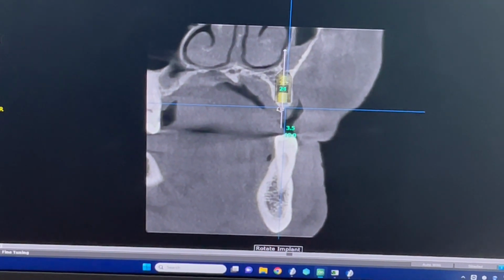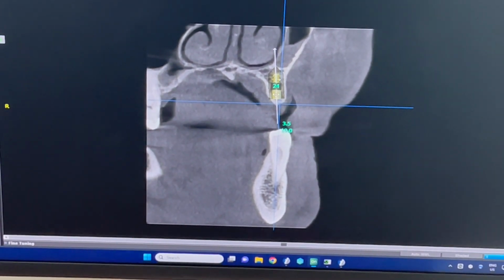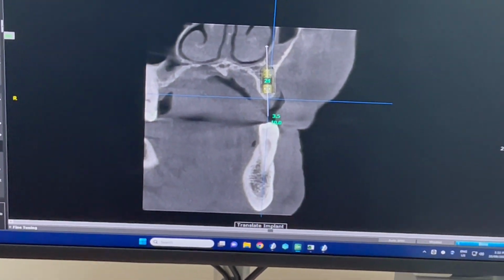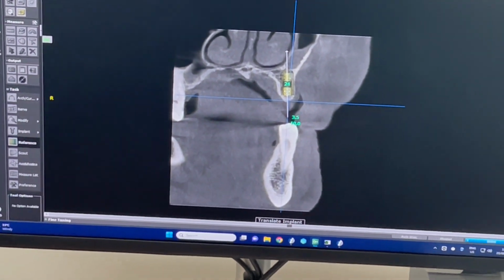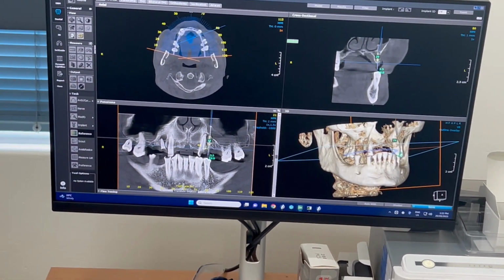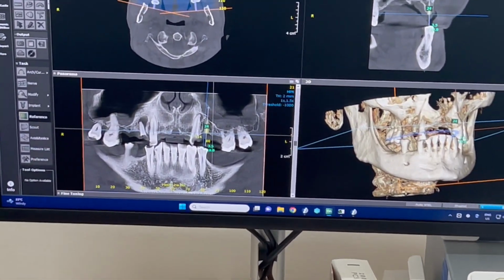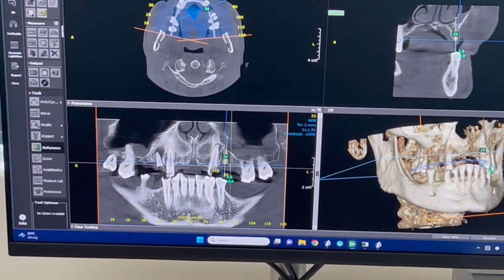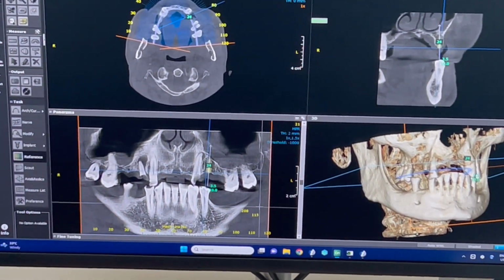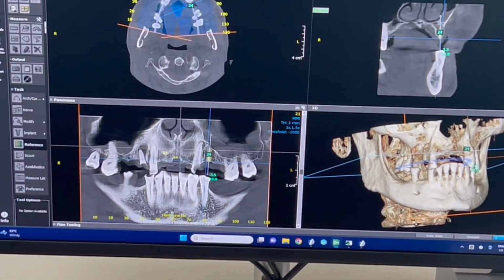And so you can see now it's very easy to orientate. I do this in front of patients if there's a 2 or 3. If I'm doing it all on 4 or 5, I bring them back the next week. So make this small again. And remember that tooth's going to be moved, just adjust the position of it. And this could be an implant, one of 4 for an all-on-4 on the upper, but just demonstrating that the bone's okay, we've got room to fit things in.